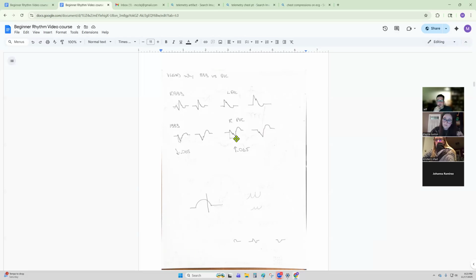Where normally your full QRS measurement would be all the way to the end of the QRS at the beginning of the T wave, we're measuring the downward point. We're measuring the activation time of the ventricle. That makes sense. This will be a lot easier sitting next to me, and we've got people to compare to.